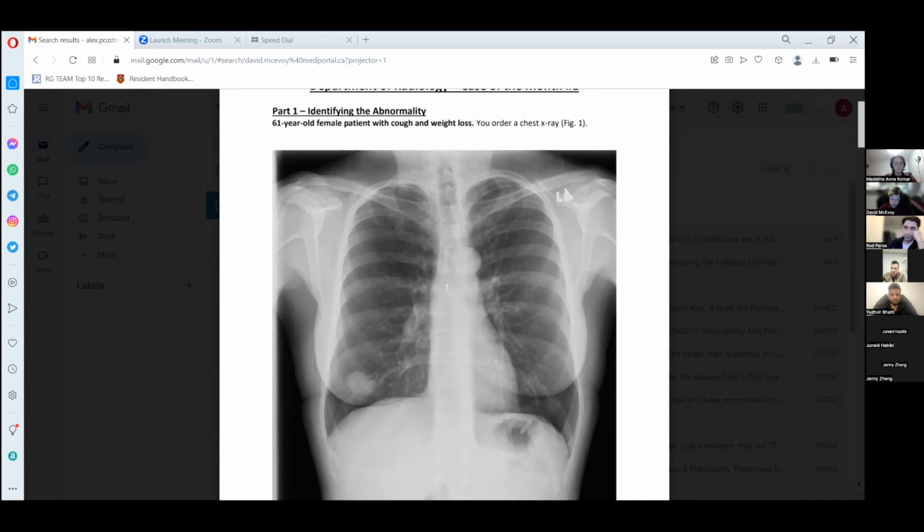It's usually a little bit easier to see on an actual workstation or if you're looking at the actual X-ray, but it also takes a little bit of adjustment to see it very well. Here, I agree, it's very faint. It's a bit subtle to see, so you just have to probably believe me that there is a very, very slight contour of the carina there, and that's where the trachea is splitting into the left and the right main bronchi.